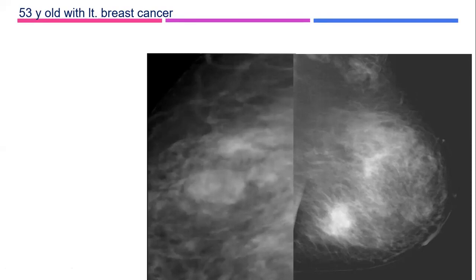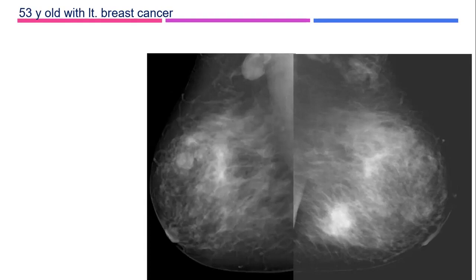But even if I told you it was a cyst, you have to tell me there is some architectural distortion in the area. We have to look for the reason for this distortion, and we have to look for this pathological axillary lymphadenopathy, suspicious lymph node. You see, that is why I missed these findings.